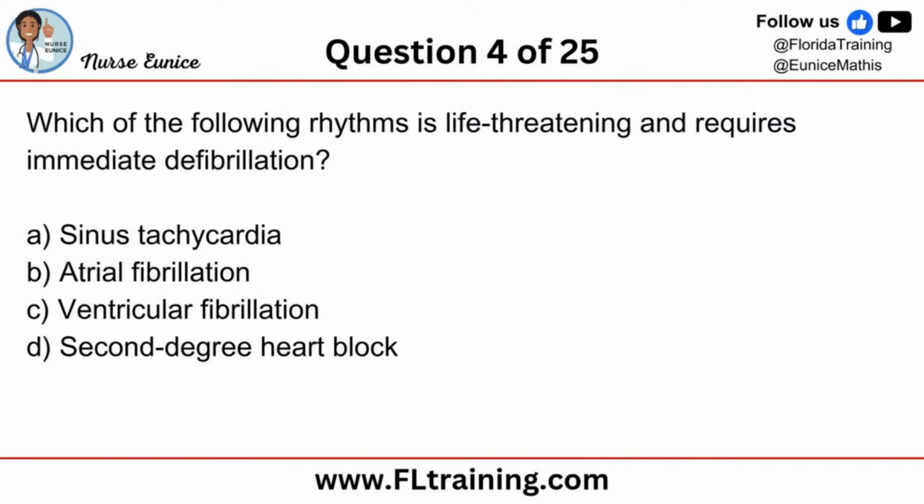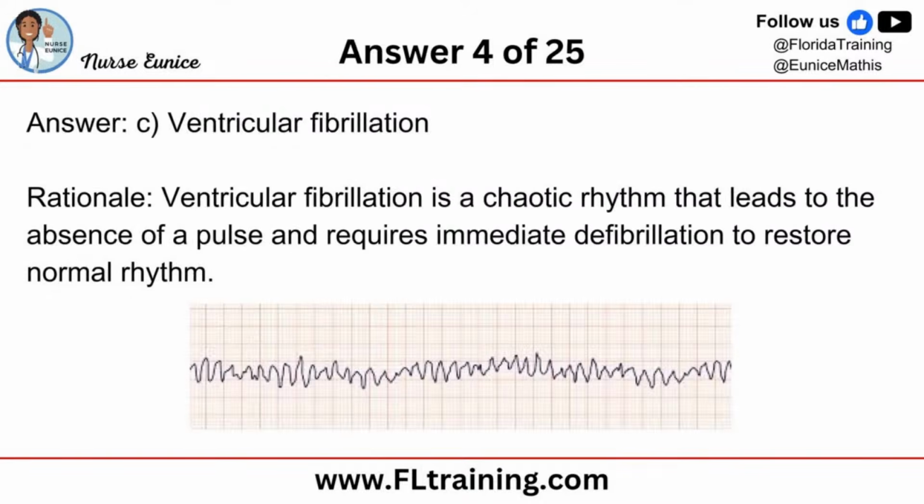So whenever you think of defibrillation, I want you to think of ventricular fibrillation. So the term that we use is that we defib for VFib. And so look at those flutter waves, but they're wide and bizarre. So if it's wide, that usually means that the rhythm is being generated from the ventricles, the bottom of the heart.